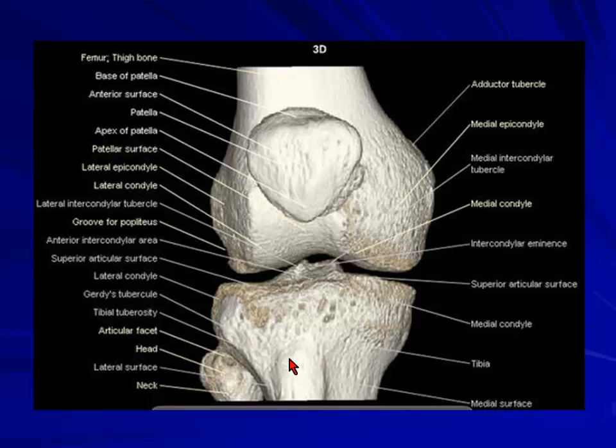That's the tibial tuberosity. This is the crest. So you know these are the two plateaus, these are the two condyles. So you can either say intercondylar ridges or crest. This is lateral, so this could be lateral crest, and this is medial, this could be medial crest. Very simple, isn't it? So I think that is the basics of the anatomy of the knee. I don't want to go into these grooves, popliteus and all that. You don't need to know that.